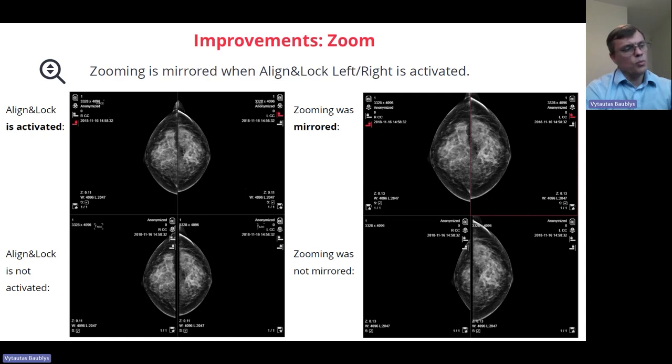So you always needed to move the mammo image to the left to see the image which is covered. And with proper configuration, you now see the clear image on top. That's how it should look if you properly configure your account. Then nothing covers your mammo images, and you can zoom in and out very efficiently. Later on you will see, and I believe most of our users will be amazed by this change, especially those who work with mammo images.